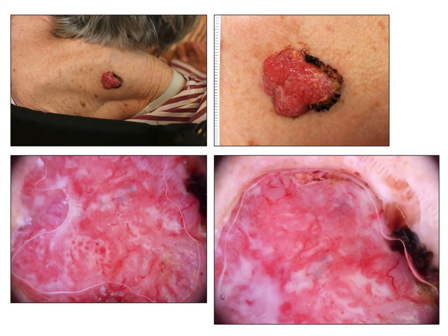We observe an atypical vascular structure with all the possible definitions, multiple vessels, presence of milky red areas, presence of linear and irregular vessels. This aspect is highly suggestive of a malignant tumor, but it could be ulcerated basal cell carcinoma, squamous cell carcinoma, Merkel cell tumor. It could be an amelanotic melanoma. It is impossible to tell on the basis of this image.